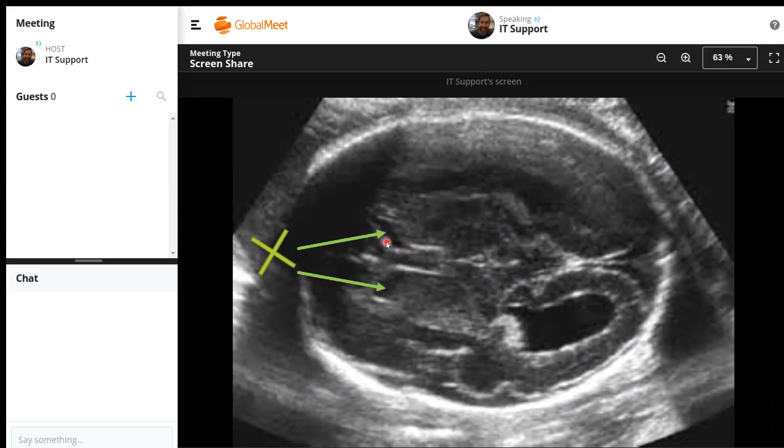These structures here and here are the anterior lateral ventricle. This posterior part and this anterior part are technically connected. They're both the lateral ventricle, but we should not see them together in the same plane. If we did, then we would think ventriculomegaly. The horns of the anterior lateral ventricle should be bordering that choroid plexus, which is right here.